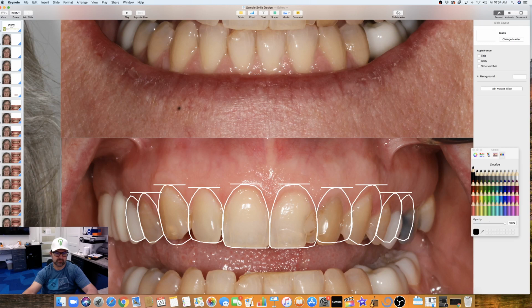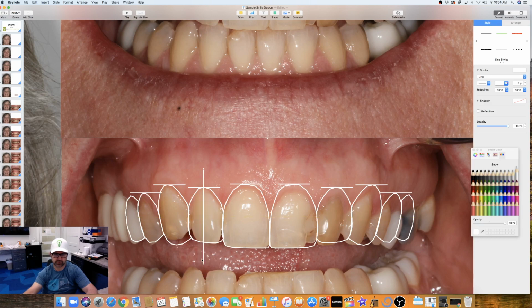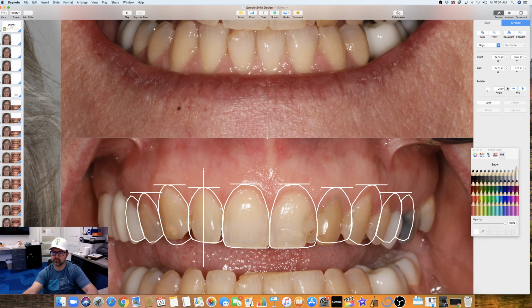The other thing you might want to do, just like you did with the existing teeth, is now change your orientation, which will help your ceramist, or if you're the ceramist, will help you maintain a focus on the proper orientation or inclination of those teeth. Usually the central is not quite as angled, so we just did that.